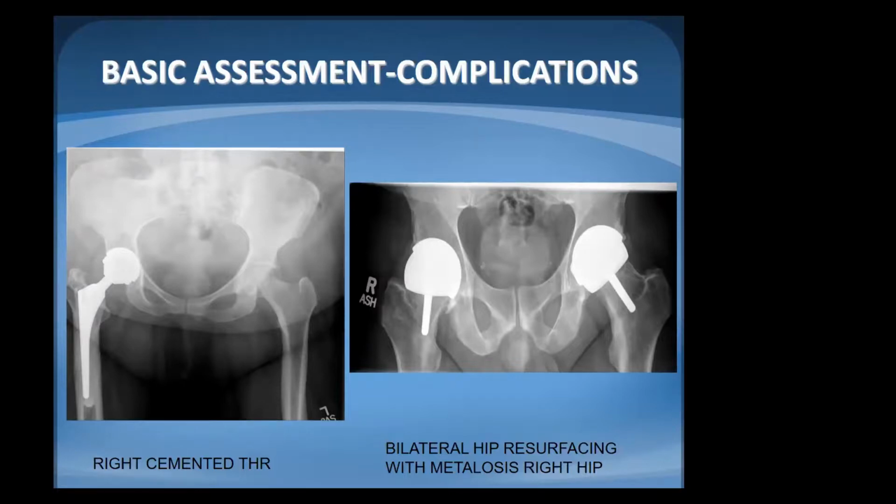So there are deposits of metal from the orthopedic procedure, which can cause a reaction very similar to a joint effusion with a little bit of debris, which is recognized on MRI, but is also recognized, and you can have a look, on the plain film, and you should report it. So this is an example of metallosis associated with the resurfacing procedure of the hip.